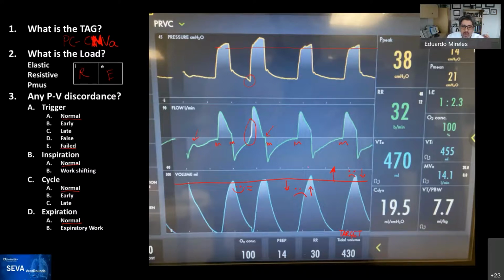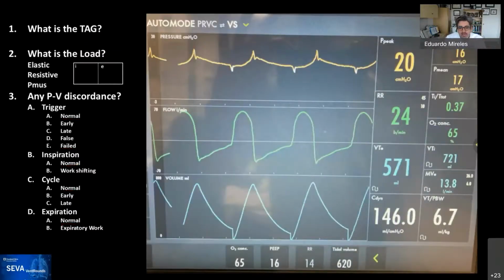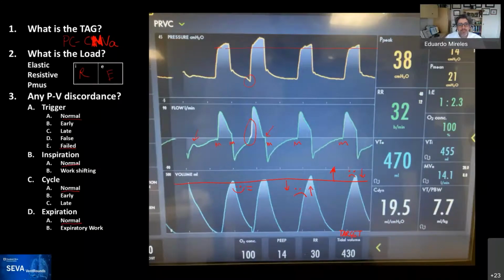And so it always happens after the last breath: the exhaled tidal volume says, okay, we are at target or not at target, and boom, it will change it, or the inspiratory tidal volume. Every ventilator has a different algorithm. And some of them you may be able to set how much they can drop, the lowest limit of dropping the pressure. But in others, just as in this one, it can go all the way down to 0. So this is a good example of that, in which it goes down to 0, but we're going to read that in a second.